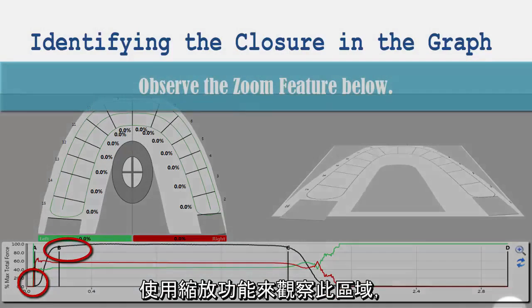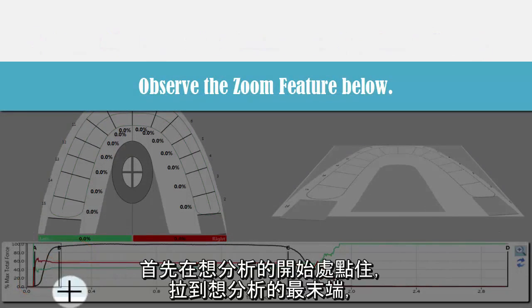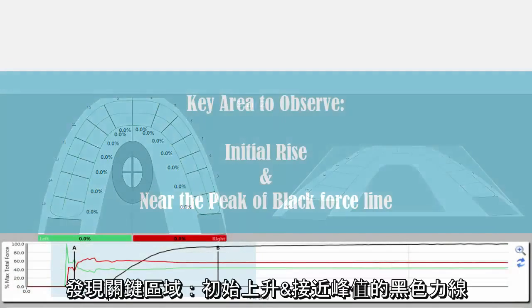Watch as we use the zoom feature to focus in on this area. First, click on the magnifying glass and then click and drag a box around the beginning of the graph.